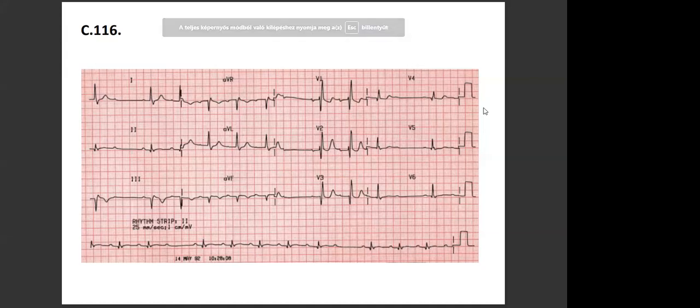So first, heart rate. It's arrhythmic. The heart rate cannot be arrhythmic. The rhythmicity is arrhythmic. The heart rate is a certain number. Heart rate is around 60 BPM.